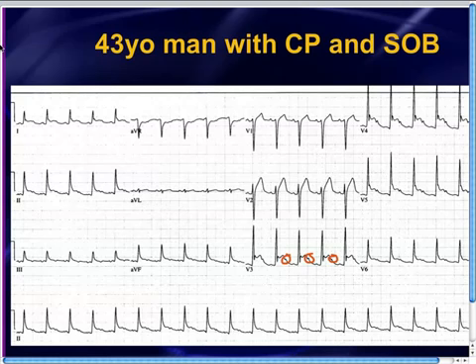I'm not really sure exactly what's causing those little extra blips. But again, I think it's good to always be a little paranoid when you see those extra blips in there and get your calipers and map them out, because it may be extra P waves. And if those are extra P waves, you're looking at a second degree AV block with 2-to-1 conduction, right? But in this particular case, you took the time to map it out. They don't map out. And so that turns out to be just artifact.